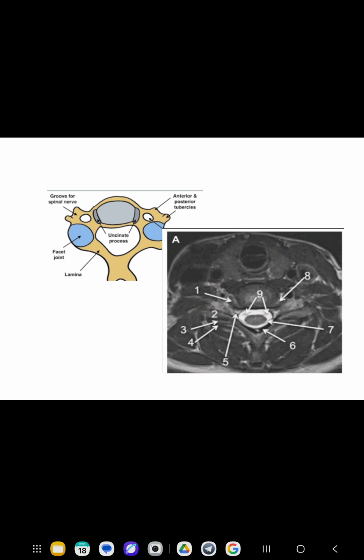Now, what we talked about is the initial cervical vertebrae, C1 and C2. When we go down to C3, C4, C5, C6 and C7, at that level the vertebra has some change. That is, they will have a vertebral body and a hook-shaped bony projection called the uncinate process. It is for the uncovertebral joint. This is articulating with the adjacent vertebra to form the uncovertebral joint.